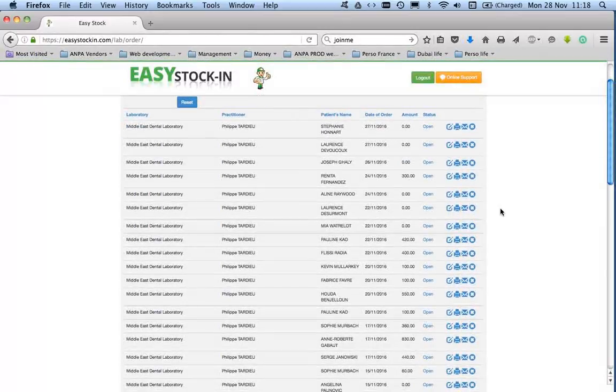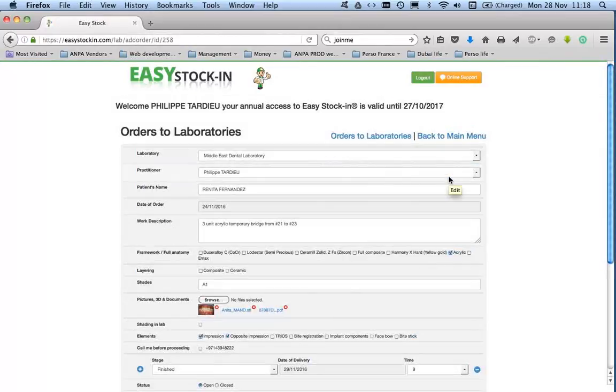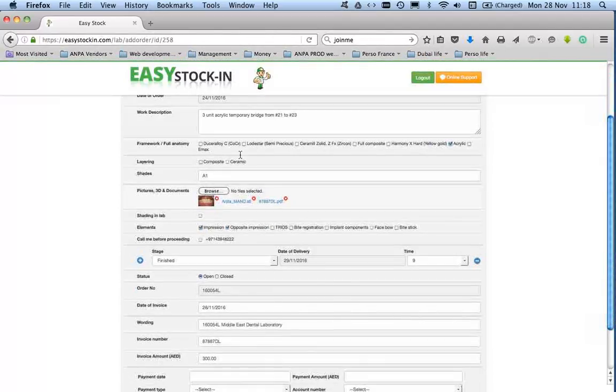So I send an order. Let me select one easy to do. I click here. This means I click to open and edit the order. I have the laboratory, I have the practitioner, I have the patient's name, I have the date of order. What do I order? A 3-unit acrylic temporary bridge from 21st to 23.